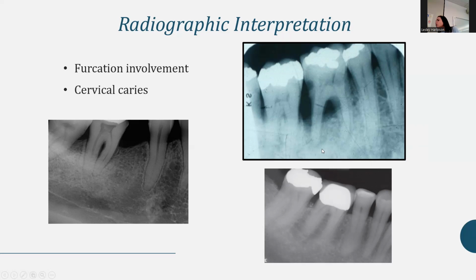And then also noting some of the bone level, like seeing how this bone level comes down at quite a slant there. This one looks a little slanted as well. But these CEJs might be off. This CEJ is here, and then this CEJ seems like it would naturally be here. So I still feel like that's actually more horizontal bone loss, even though it kind of looks tilted. So sometimes it can be a little tricky that way.